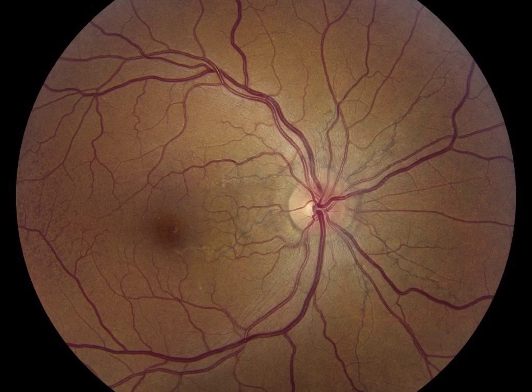And you also bring up a good point. When I'm looking at a photo, I know what this is, I've seen it like 30 times. But when I'm seeing a new photo, it helps to have a routine, a checklist that you go through. So I'll say color fundus photo of the right eye, clear media, so vitreous, whatever. The disc looks good, margins, nice coloration to it, no pallor. The blood vessels, there's normal tortuosity, no attenuation, there's no AV crossing change, things like that.